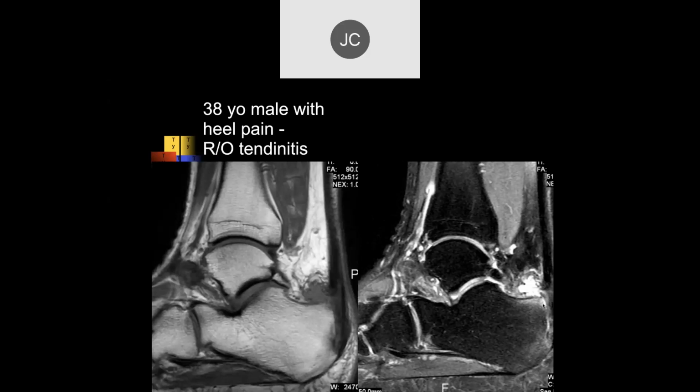Go ahead, John. This is avulsed anteriorly from bone, and part of the tendon is left attached. So about three-quarters of the tendon is lacerated and avulsed. My treatment would be the same as I've said before.